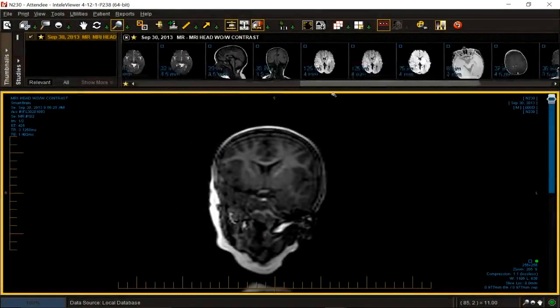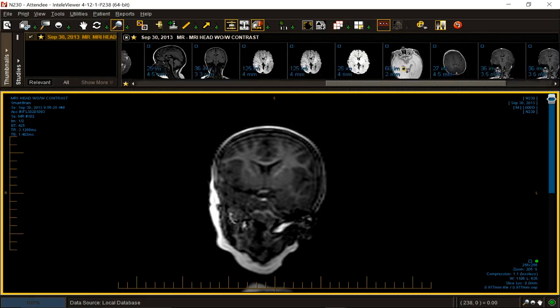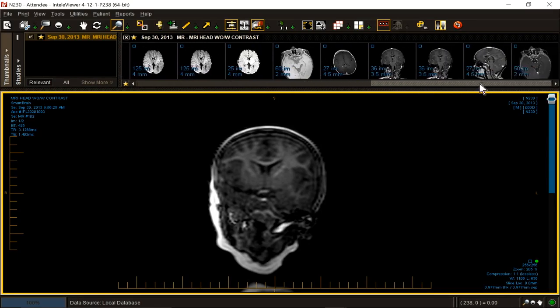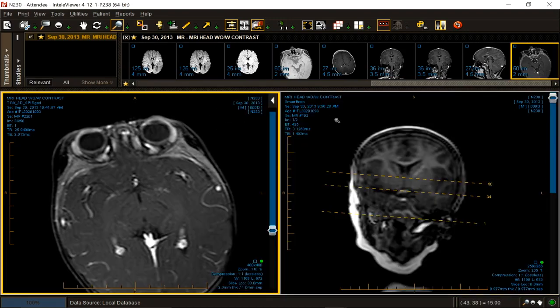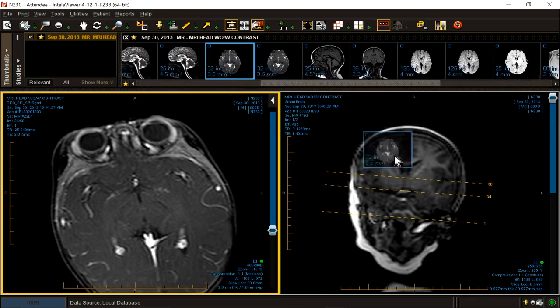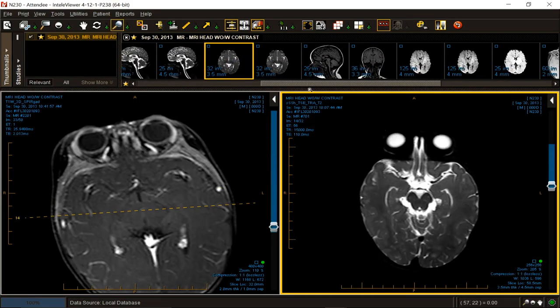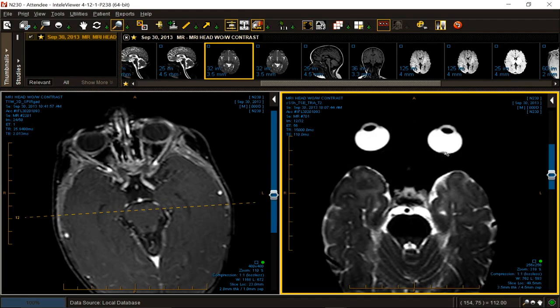As promised to several of you, just a few quick examples of pathologies you've seen. Quickly tee up your axial T2 and your axial C plus T1, which can be found at the end. Far right, hit the number 2 to get them 2 up. Pull up a T2, anyone will do. Blow them up to the same size, and you will see a lentiform low signal area in the left globe.